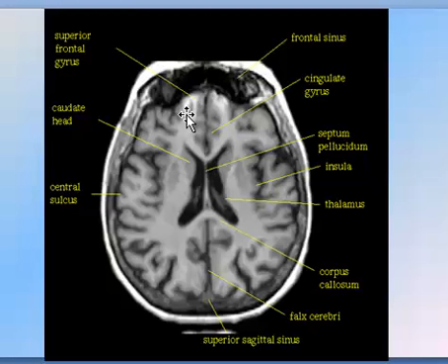Just remember this term now, it is the superior frontal gyrus, and remember that medial one, which is called the cingulate gyrus. We'll use these terms after. And another one is the central sulcus. So in the center here, that one in the middle, central sulcus, and that one medially is the cingulate, and that one anteriorly is the superior frontal gyri. So these are superior frontal gyrus, cingulate gyrus, central sulcus, the biggest sulcus along the middle of the parietal region.